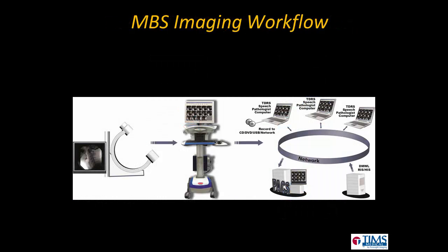Now that you've had a chance to learn a little bit about TIMS recording capabilities, let's take a look at how it impacts your workflow in a positive way as well. In this image, we have a TIMS system connected to a fluoroscope in a procedure room. It's also connected to your hospital network, as well as your hospital PACS and your DICOM modality worklist server.